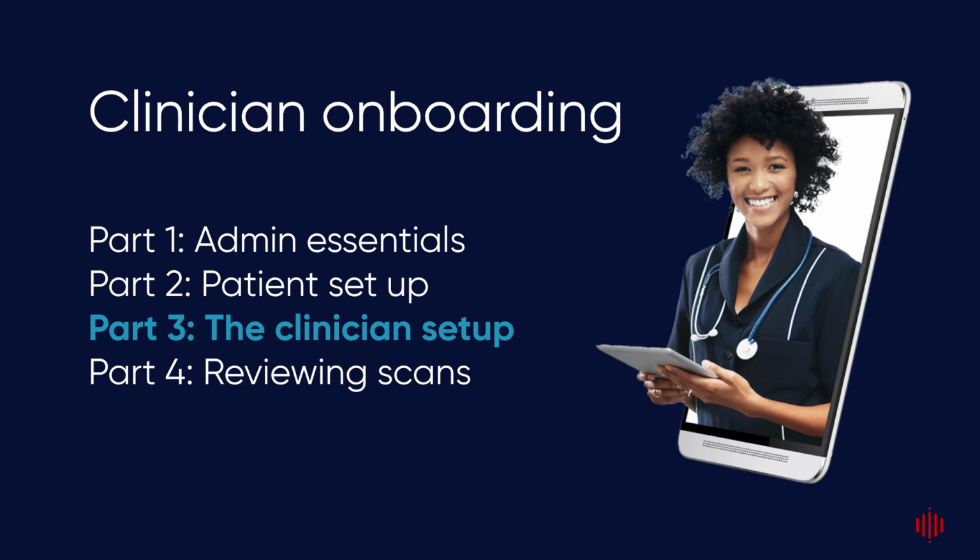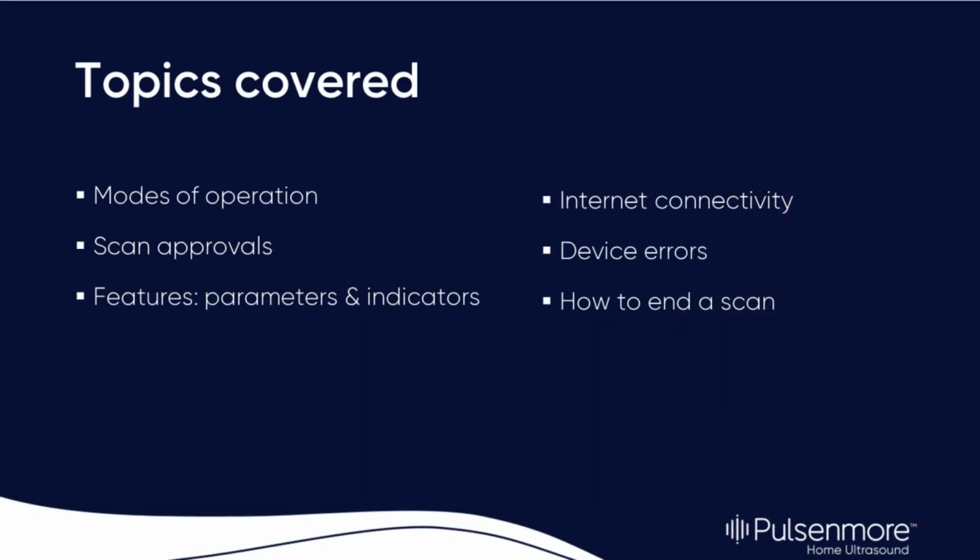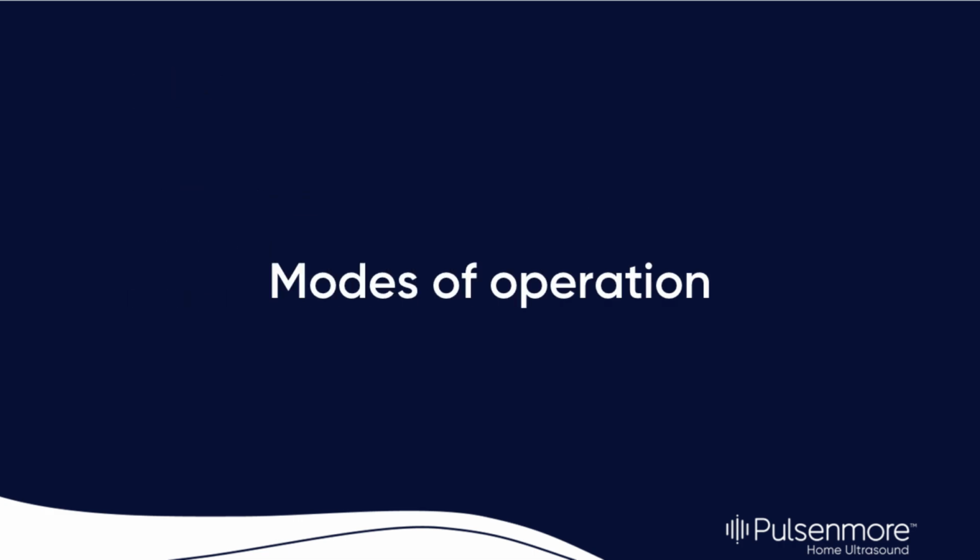We will cover the following topics: the different modes of operation, setting up scan approvals, adjusting parameters, contact and speed indicators, internet connectivity, device errors, and we will end the session by explaining how to end a scan. The Pulsenmore modes of operation.